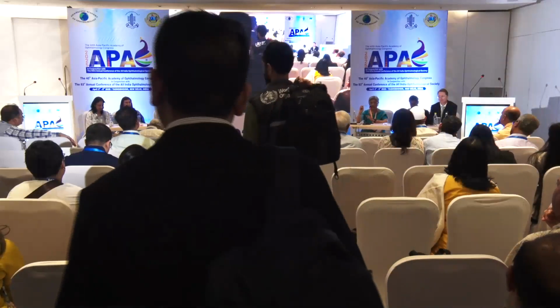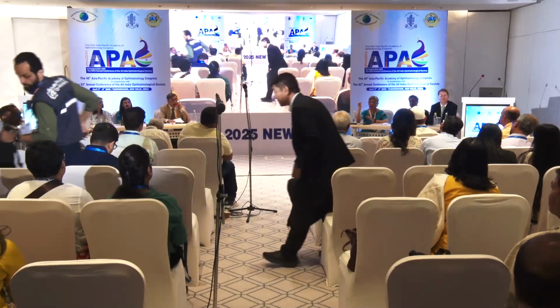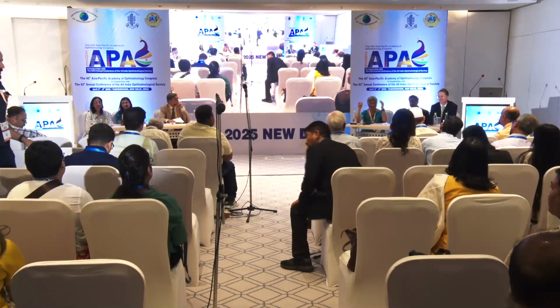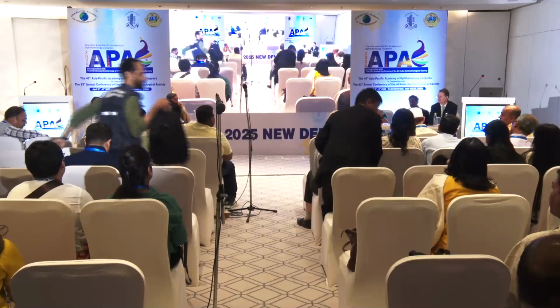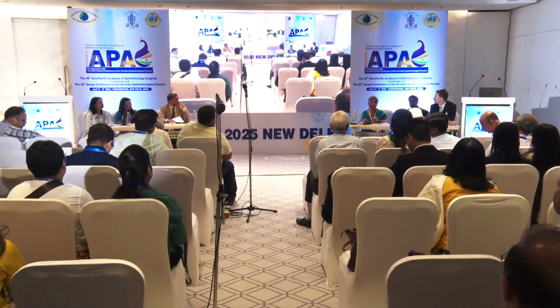So, Gullstrand: 24.38 millimeters is the axial length which is taken by default in that machine. But suppose, for example, your patient has, let's say, 21 millimeters, so you do the Gullstrand and then you put in the 21 millimeters for that patient and you see what is the difference. So if you find that the profile definitely is looking lesser, then I would like to follow up that patient and investigate the patient for glaucoma. I hope that answers the question.